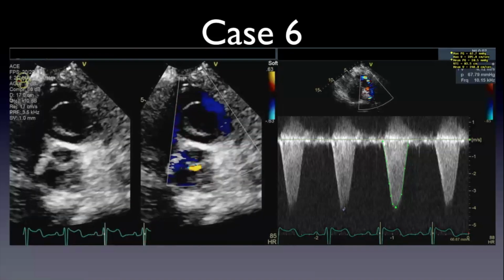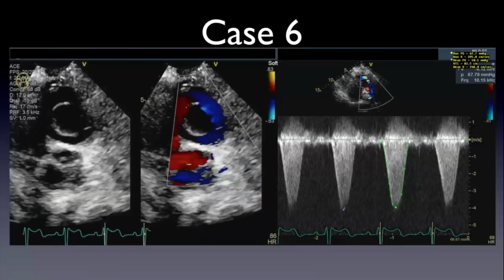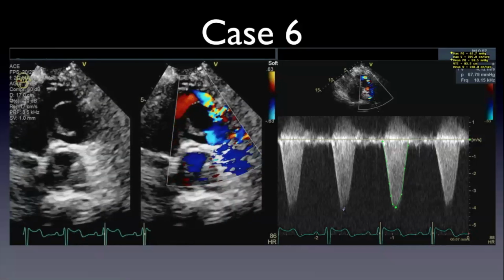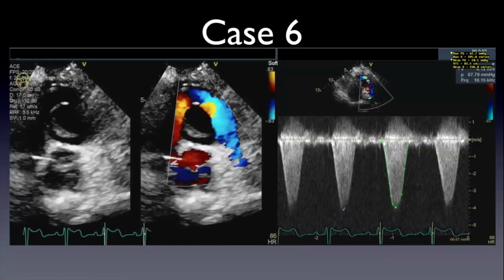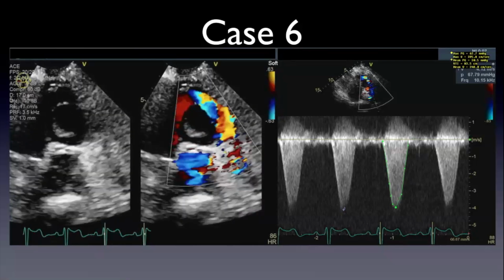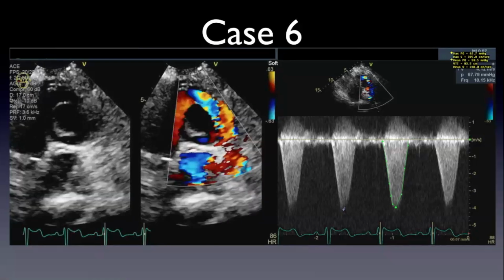Very unusual. And what's the image on the right? So that's CW. We're looking at flow acceleration around that structure. Velocity there is 4 meters per second, which is fast. I'm thinking that might be blood coming from left ventricular contraction, or if there's a severely hypertrophied RV, then maybe RV. But why is there a connection between what I'd expect LV blood flow during systole and what I'm seeing in the RV? RVOT there.